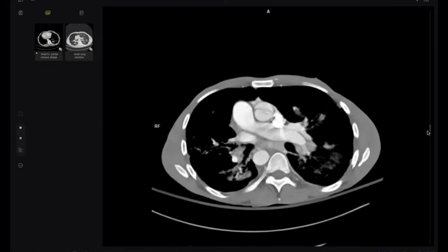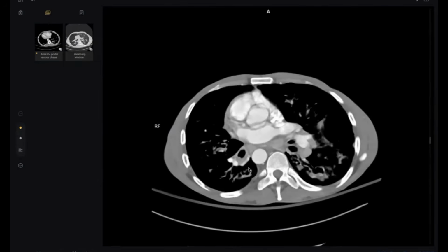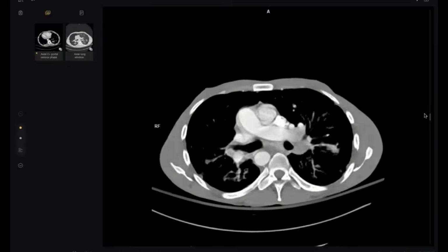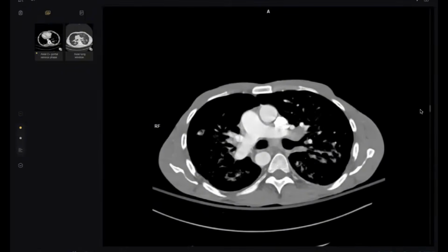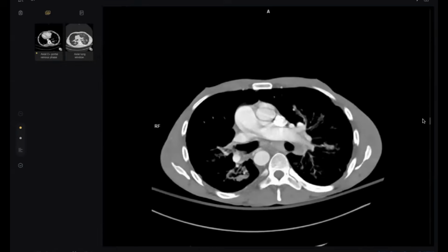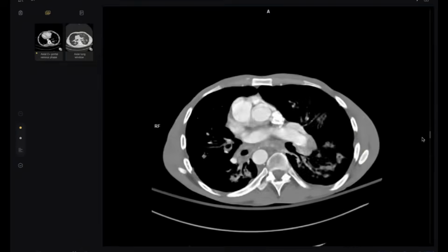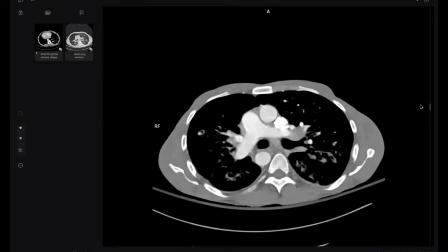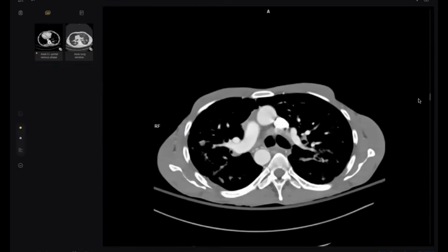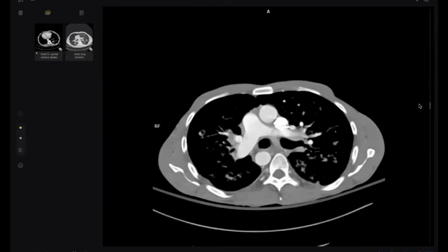You did very well when you talked about the aneurysmal dilatation here. But what else? You searched well in the main vessels, but the main vessels were normal. What about the bronchial artery? How could we detect the bronchial artery in the mediastinum? Because the bronchial artery is a systemic artery.